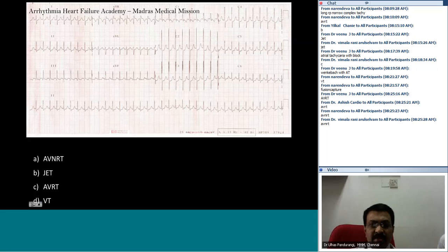Somebody said the diagnosis of AVRT. AVRT typically is associated with, if not very remarkable, subtle P waves falling onto the ST segment, resulting in an ST segment depression. Here, one negative point with respect to AVRT is no significant ST segment depression. If you have in a pediatric tachyarrhythmia significant ST segment depression, which is paroxysmal, almost always the diagnosis is AVRT.